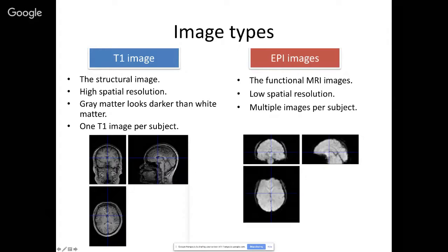On the inner side, you can see the color is brighter, which is the white matter. If you have learned neuroscience, you know the white matter is made of the fibers of the neurons. We use the white matter to transfer signals.